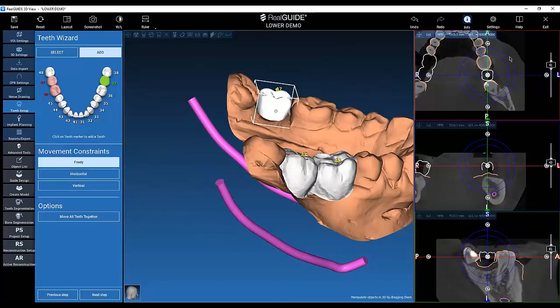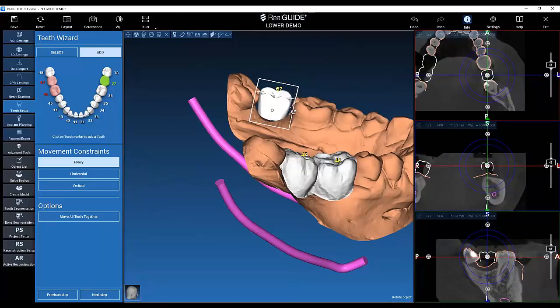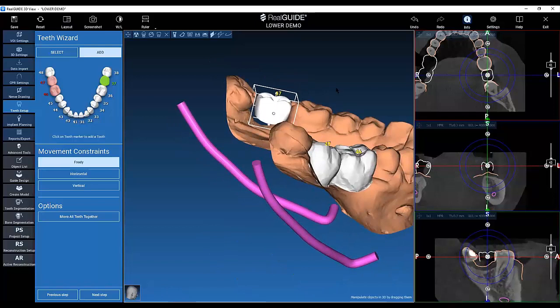You can also change the orientation by using this circle here from the 2D. You can change the dimension of your element in different directions. You can rotate and you can move, okay, as you wish. Make it larger. Okay.